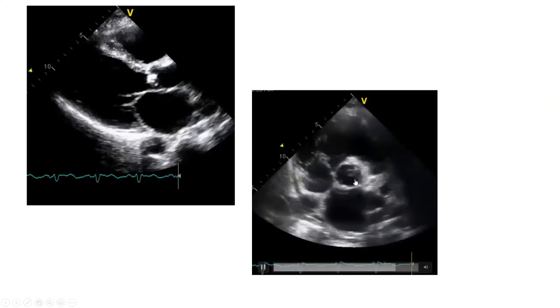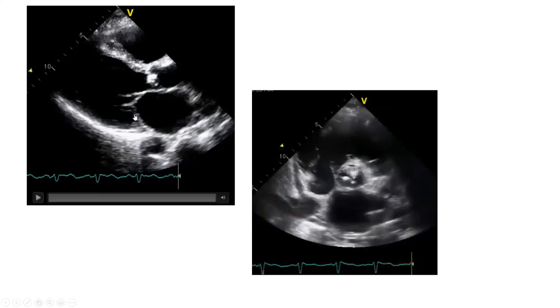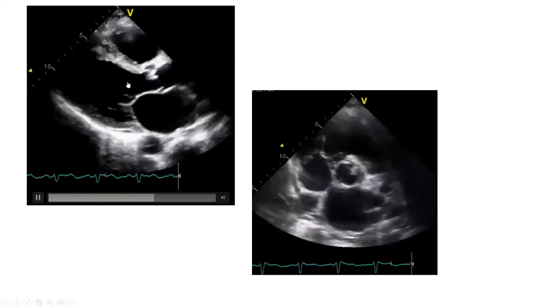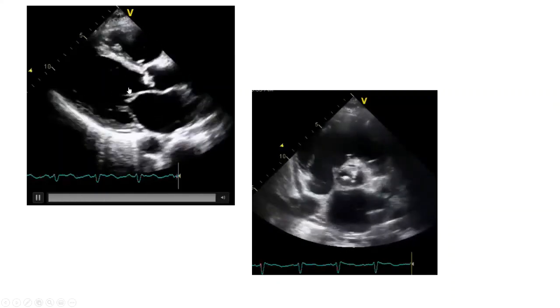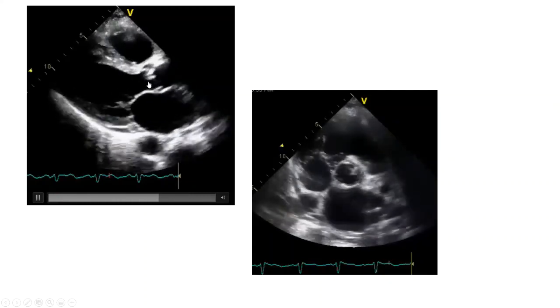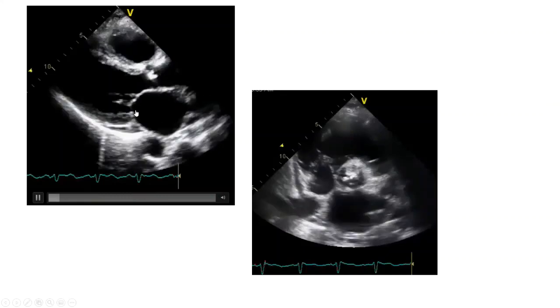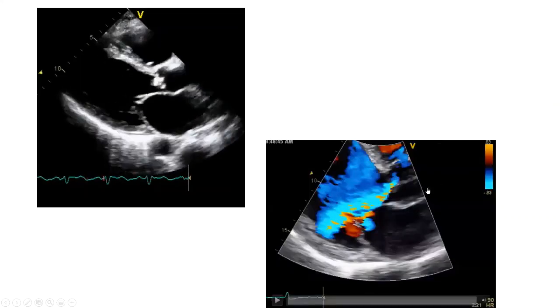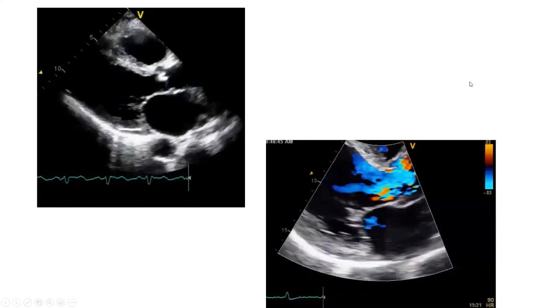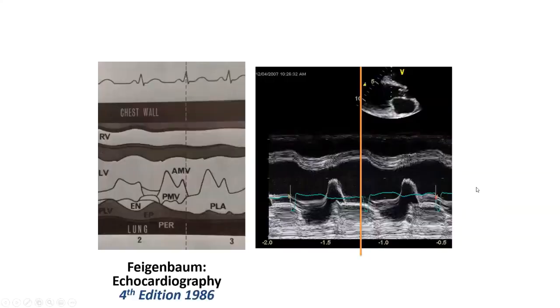You see that this is a bicuspid valve, vegetations, and reduced ejection fraction, big E-point septal separation, and part of that may be because the jet is pinning the anterior leaflet in diastole and torrential aortic regurgitation. So this is the key finding in terms of quantitating the aortic regurgitation.